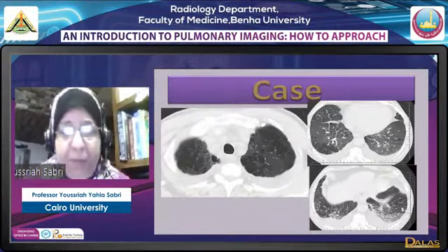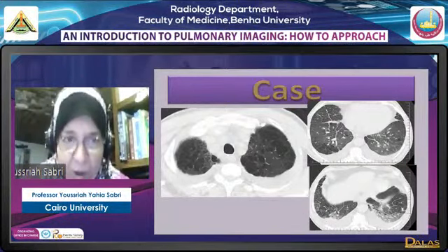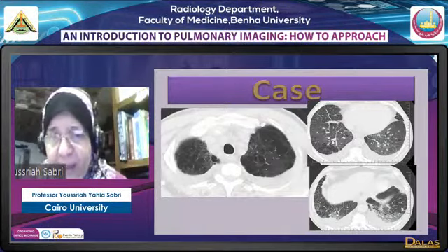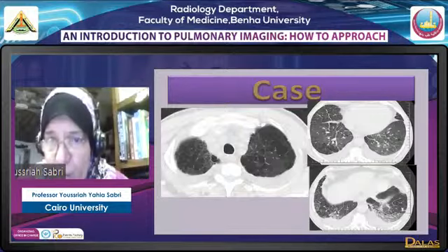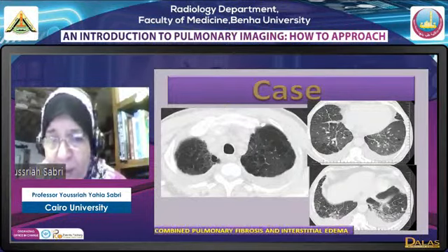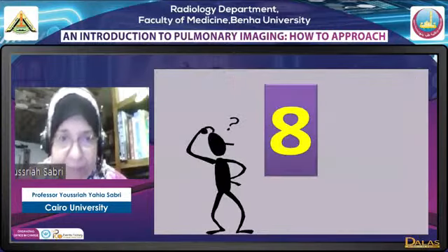Also here we have another patient who is a heavy smoker. We have centrilobular emphysema, which is marked in the upper lobes, bilateral effusion, relative cardiomegaly, and if you look basally, you will find prominent interlobular septa with the bilateral effusion. You will find fissural effusion. This patient has combined pulmonary fibrosis, pulmonary emphysema, and interstitial edema.